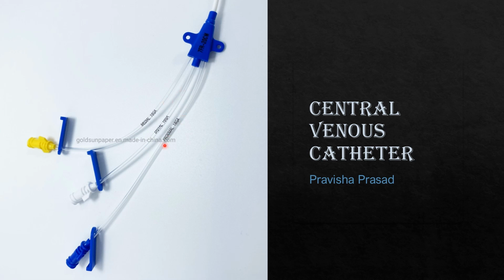And the last and final one is proximal. Proximal is also 18 gauge, which means medial and proximal are of the same gauge. Then how can you identify medial from proximal? Because proximal is proximal to the site of insertion and it is very long because it opens only near the site of insertion, and it is the longest one that we can see outside.